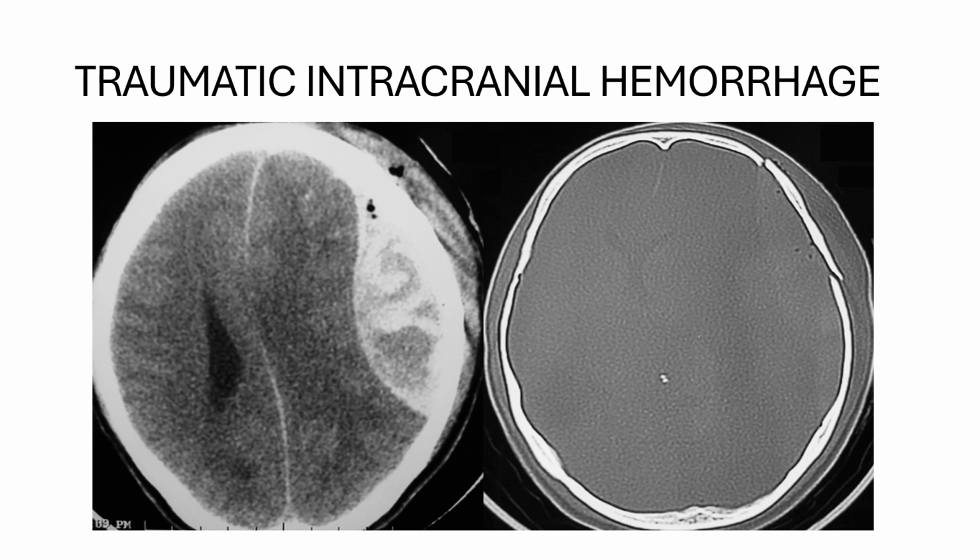In this video, I will briefly describe traumatic intracranial hemorrhage. Trauma is one of the most common causes of intracranial hemorrhage, especially in young adults and also in elderly patients. Here we can see intracranial hemorrhage associated with a calvarial bone fracture.